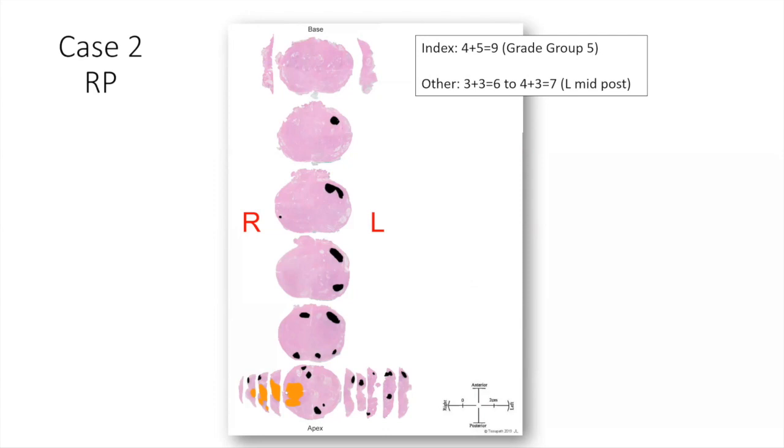This area here that I'm circling around now, that's definitely transition zone, and then this little bulge out into the peripheral zone. But they were in continuity with each other, so it really is straddling both. Yeah, but it may well be that it's gone from the peripheral zone into the transition zone, if it's such an aggressive tumor as a 4+5. Mm. Yeah, I think if we'd seen any peripheral zone diffusion signal like that, we would have definitely called it very positive.